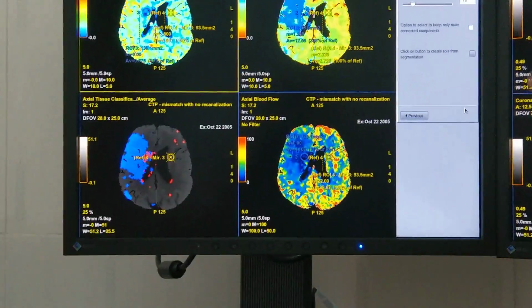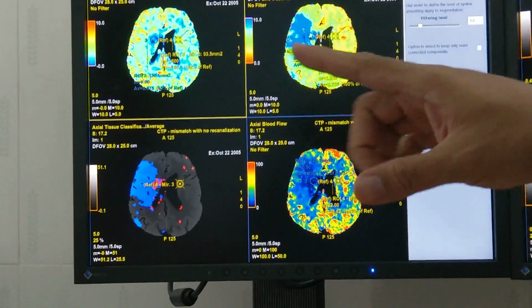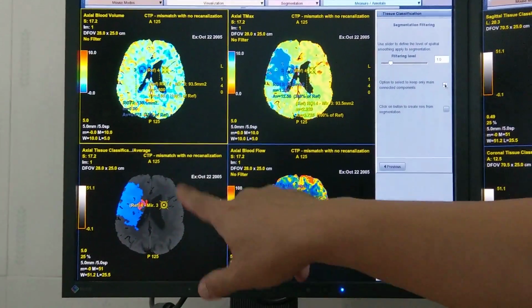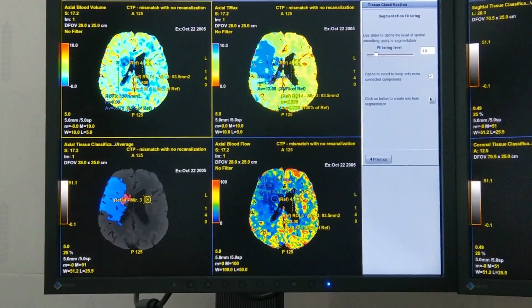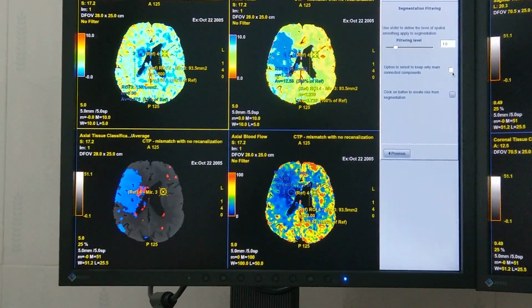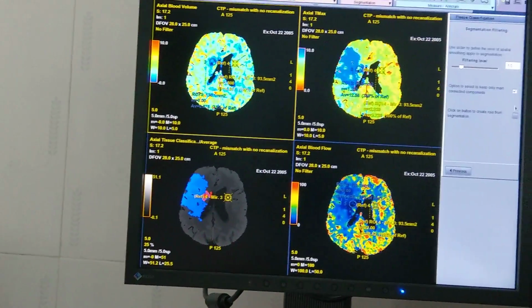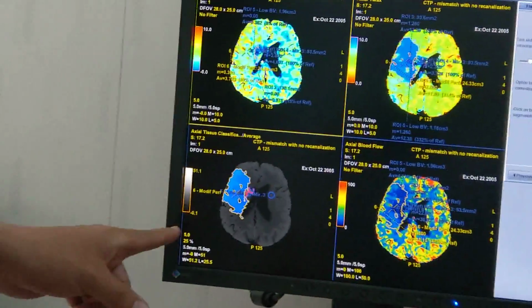So if you want to draw the ROI automatically, you click here so that all the noise is gone. Right? Khi mọi người bật các chế độ kia thì tất cả những phần không liên quan, phần noise nhiều thì nó sẽ off đi. Okay. Then you draw. Cái này để mình segmentation, phân biệt cái vùng.